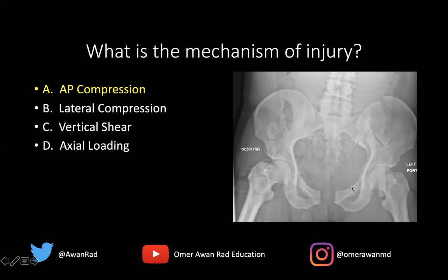Of course, it's hard to see here, but this line right here is the anterior wall of the acetabulum, and this here more laterally is the posterior wall of the acetabulum. So disruption of either line will reflect an anterior wall or a posterior wall acetabular injury. These here are the arcuate lines. Always important to scrutinize these lines. Disruption of this line will reflect a sacral fracture, particularly a sacral insufficiency fracture.